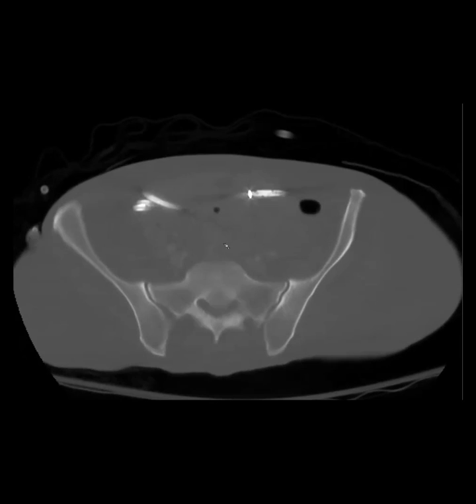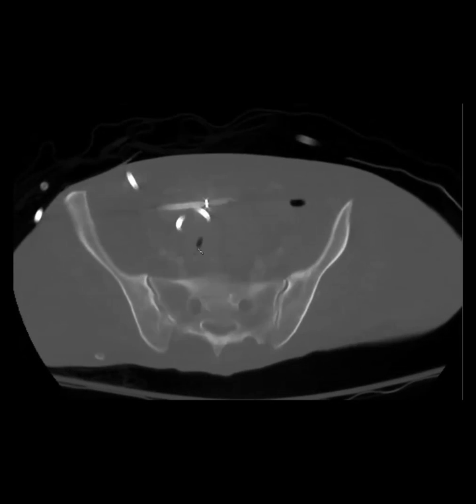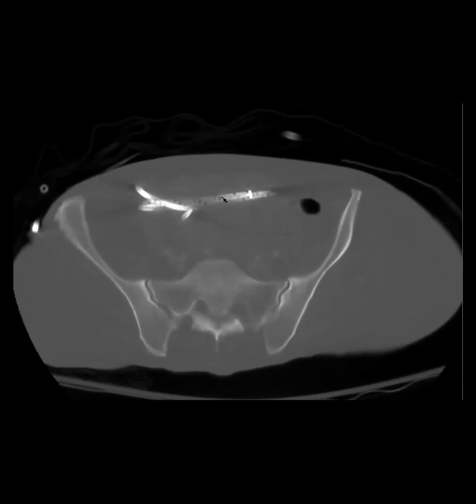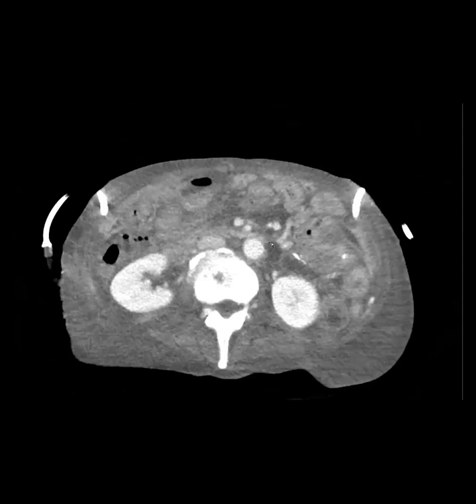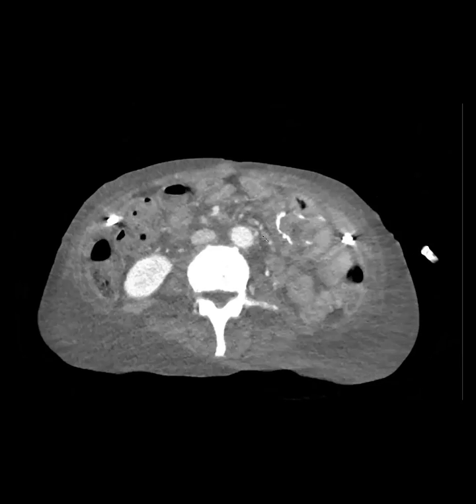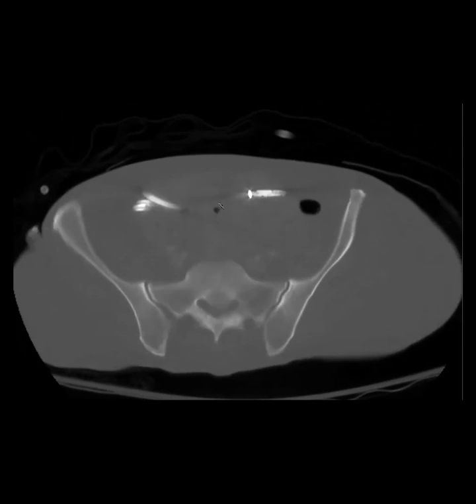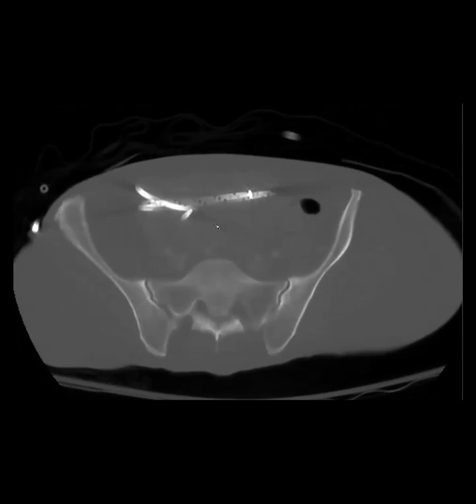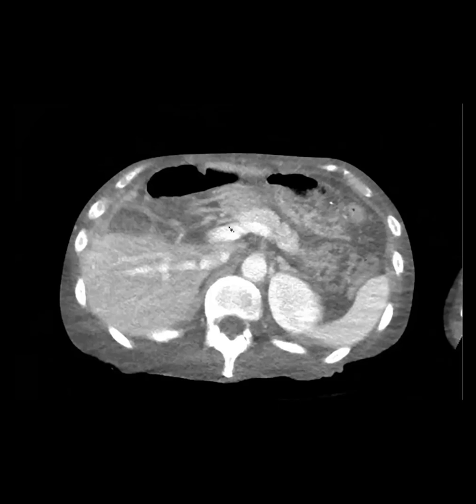When I first saw these drains, I thought they were surgical drains because they don't look like the little pigtails that we usually put in. But anyway, they put in a biliary drain, and they even added extra holes, so they're able to remove most of that fluid. It's like a hose. I know, I like it. So I was impressed. I mean, you can get a CA 19-9 very quickly added to the labs.